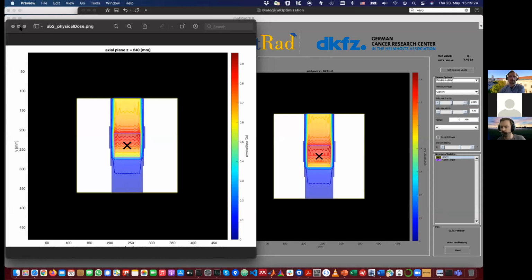All right. Is there a question in the chat? Yes, I think there are some issues because biological optimization is so heavy on computational load. So this is kind of an experiment here because it really doubles all the effort in a sense, and even more than doubles the computational effort, and it might get slow. And we had, I think, also one MATLAB standalone crash and then not open, which I guess is due to some temporary files that won't go away.